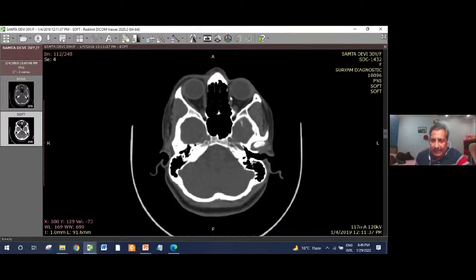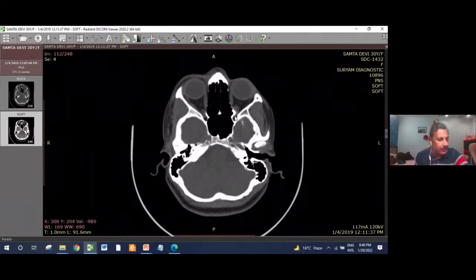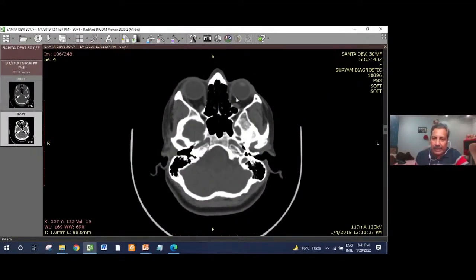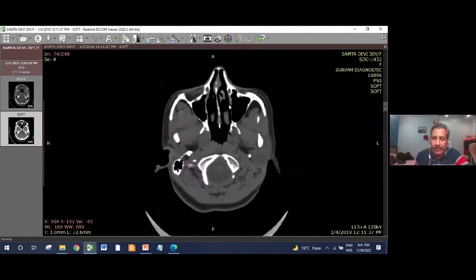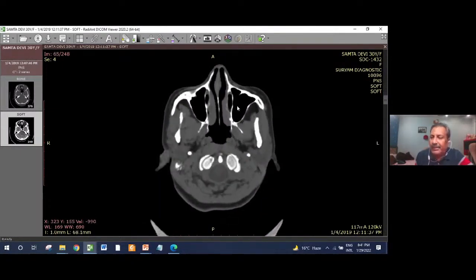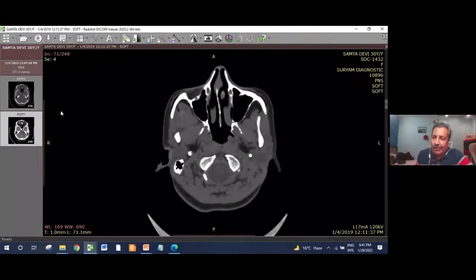See this, what I was telling, this is the fat pad interposed between the sinuses and the medial rectus anteriorly, which is conspicuously absent behind, in the postethmoids. That is how you can make out the fine details of certain areas on the axial planes better as compared to the coronal planes. But by and large, we must see the CT scan in all three planes simultaneously.